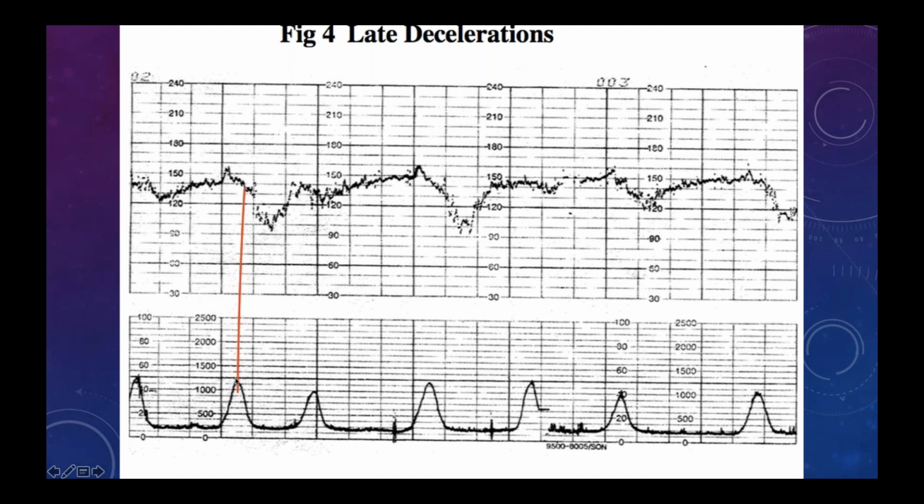This is the peak of contraction. Now see, here the deceleration started and it ends after the contraction. The contraction has already ended, then it ends. So this is late. This is late.